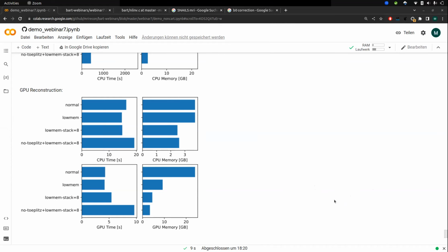One question is, how will I know whether the sensitivity map really helped in the reconstruction? In other words, if the sensitivity map was not used, what kind of artifacts or quality reduction can I expect? One option to check that is, when we do the pics reconstruction, we have a stack of 8 coils, right? But we could reconstruct the image of each coil separately.